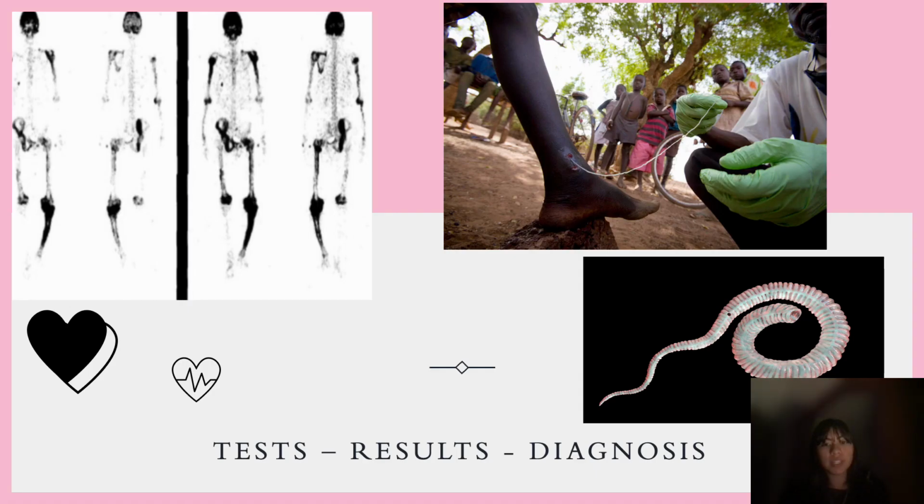So the main test for Paget disease is an x-ray just to see if the bones have changed, and a bone scan just to see how this disease has progressed in the patient. A scintigraphy, also known as a bone scan, basically they inject radioactive substances into your veins to once again check how the patient has been impacted. And patient A had a technetium-99 conjugated with methylene bisphosphonate bone scan, and this is what it looks like right here.